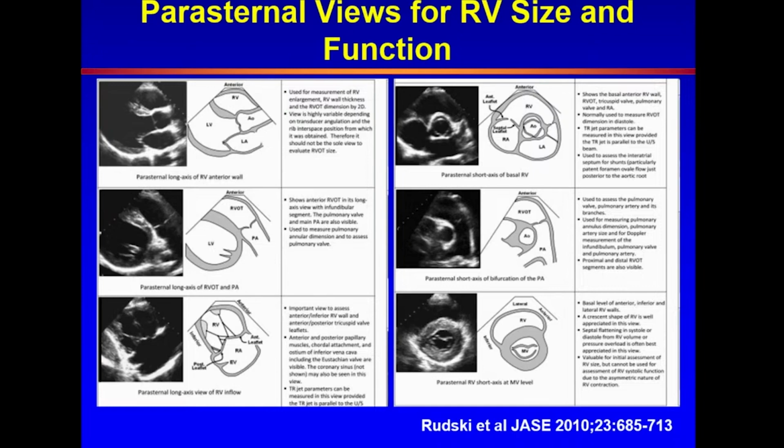with the exception of sometimes, particularly in cases of arrhythmogenic cardiomyopathy, where you want measurements from several locations in the right ventricle, since the pathology can be patchy. You can go from the junction between the septum and the aortic root to a perpendicular point, go up perpendicular to the corresponding point of the free wall of the infundibulum here, or the RV outflow tract, really.